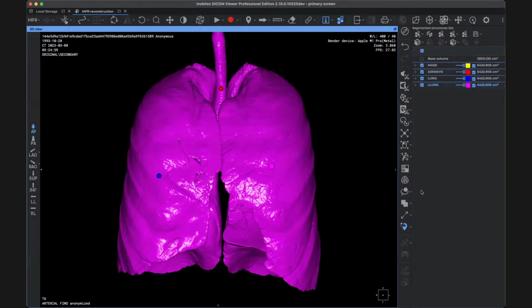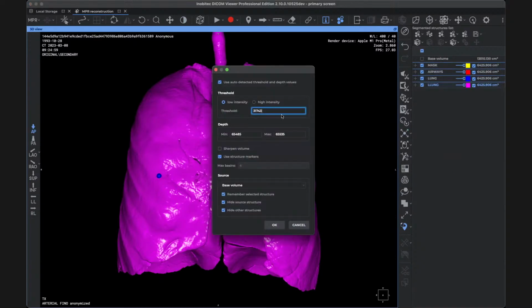After that, we're going to use the watershed method here. It's important to notice that the source of the image you're going to isolate will interfere in your final result.